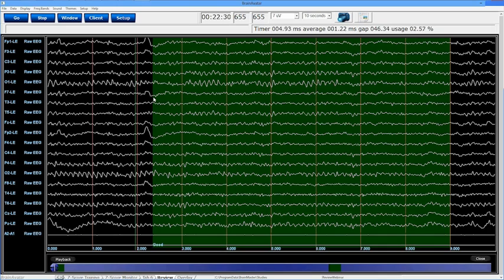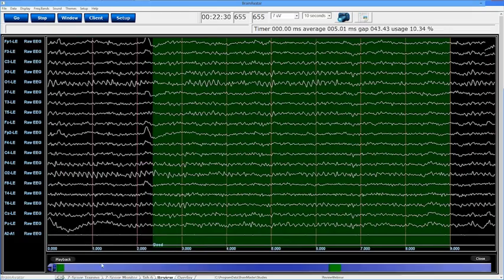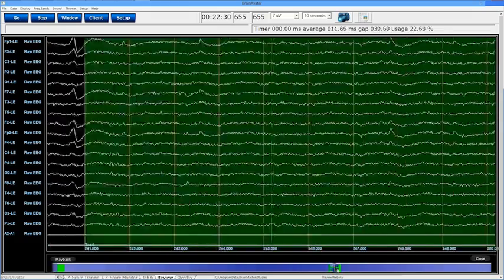Now, as I mark as good, there are two things that happen. One, if I click off elsewhere, you're going to see this in a light green right here. You're going to see a marking right down here that says good. And also on my bar down here, you're going to see this green area that popped up. All right, so as you can see, this is the second green area because I've got another green area right here.